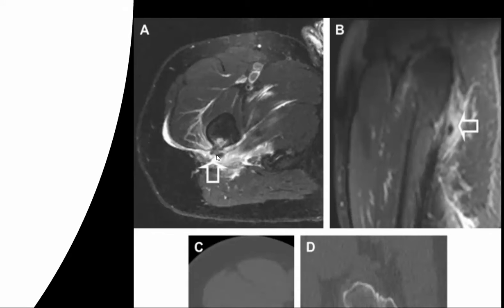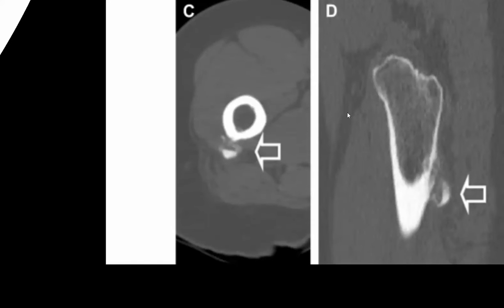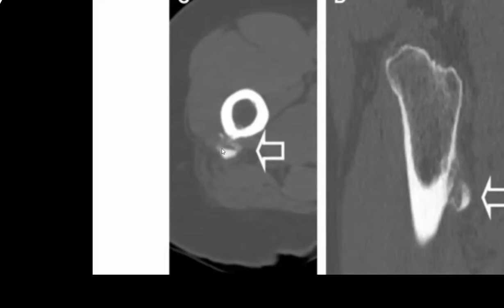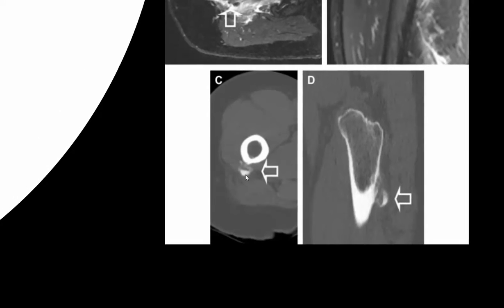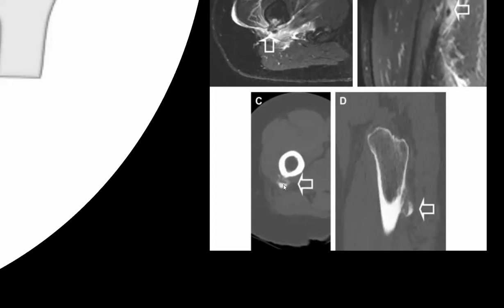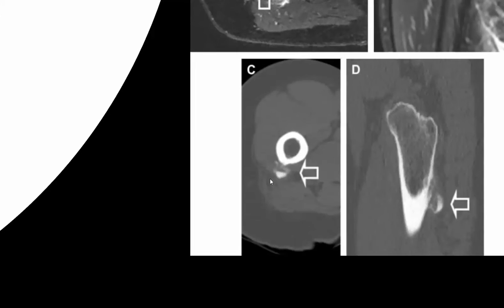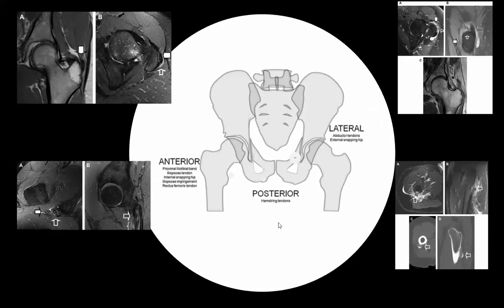It causes a really severe inflammatory reaction, and it's painful in the hip tendons, it's painful in the shoulder tendons. And it was confirmed with a CT actually. CT is very good for calcium, not so good for soft tissues, but you can see this deposit of calcium within the tendons themselves. And actually we treat these, we can barbotage them. Barbotage is basically a way in which we, under ultrasound guidance, stick a needle in there, break it up, suck out the calcium and replace it with steroid. So bear us in mind if you come across any of these.